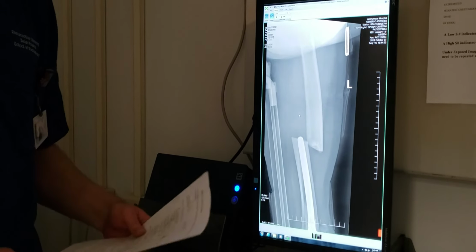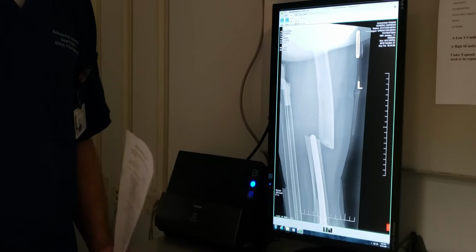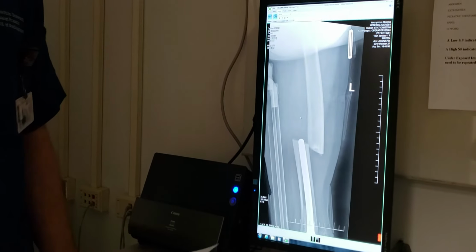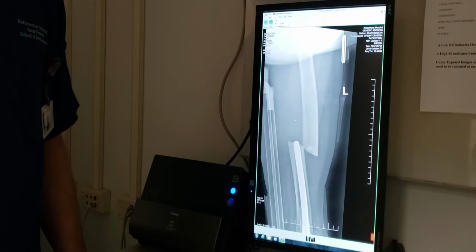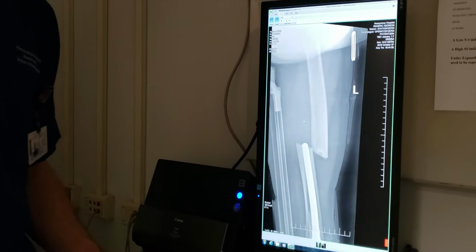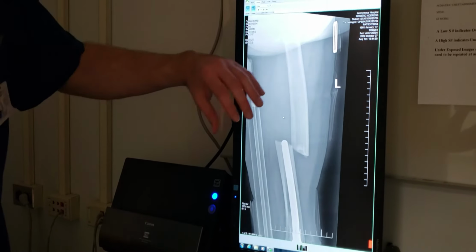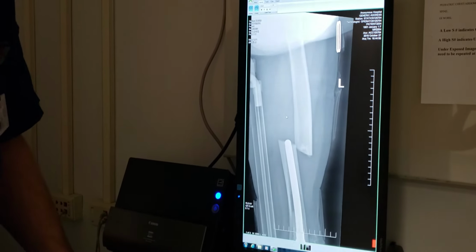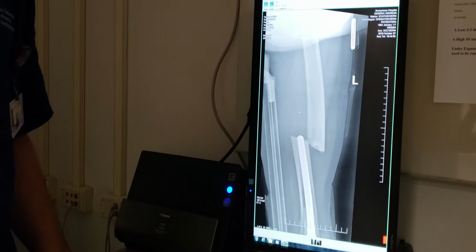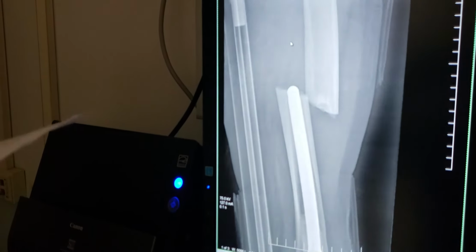The central ray normally wouldn't be angled at all for this image, but I would guess that they angled a little bit to try and obtain a more lateral view of the femur, since the patient's movement was very limited. The anatomical part shouldn't really be oblique, but it looks to me like it's just a little bit not quite true. But with a fracture like this right across the hardware, it's going to be tough to get a perfect 90-degree angle for the patient's lateral.